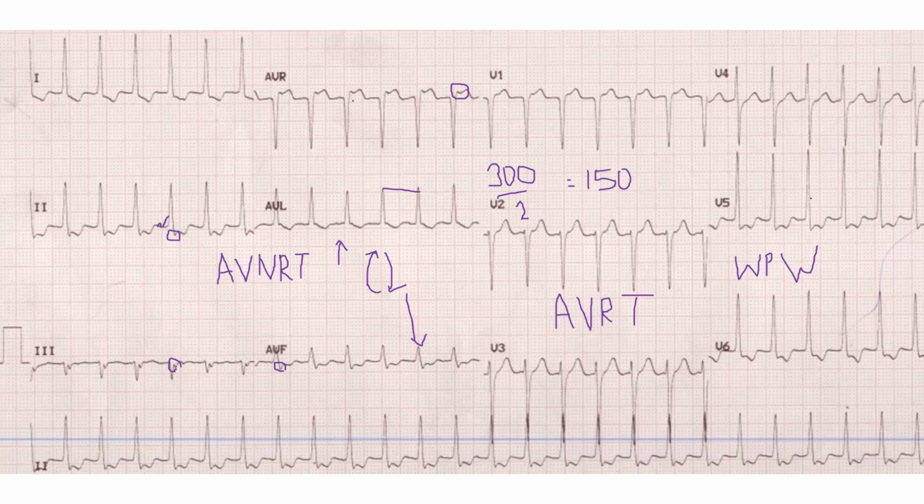In this ECG, there is another feature, that is deep S waves in V1 and tall R waves in lateral leads. So there is some underlying left ventricular hypertrophy also, which could have contributed to this pattern. So all these aspects you should consider.